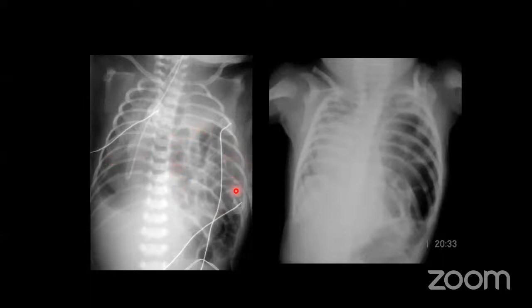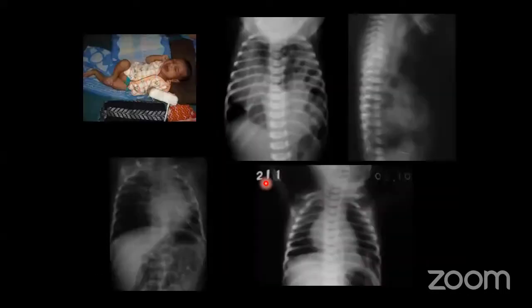So this is the congenital diaphragmatic hernia. Before sending to the pediatric surgeon, just treat the child with sildenafil to allay the pulmonary hypertension. This is another X-ray. We can see multiple air-fluid levels, but if you look carefully, there are triangular shadows over there. So there is a gap in the anterior part.